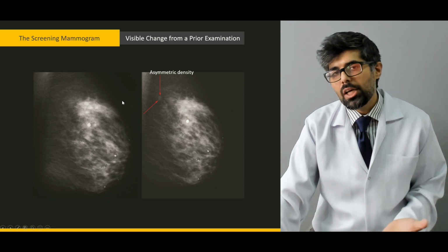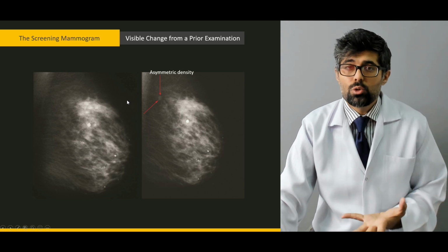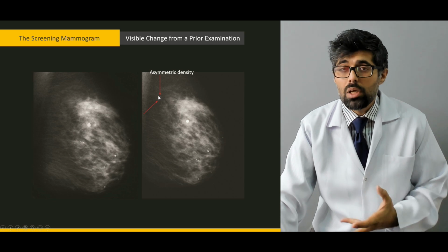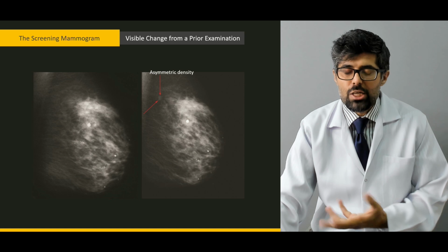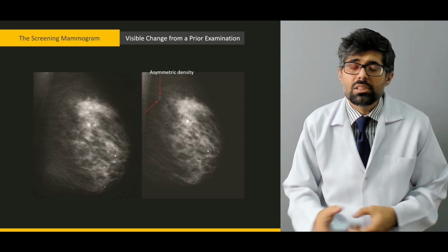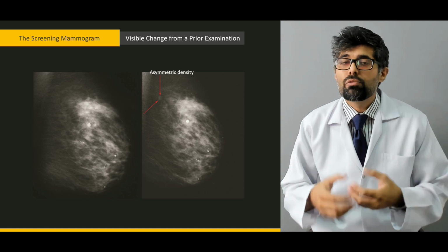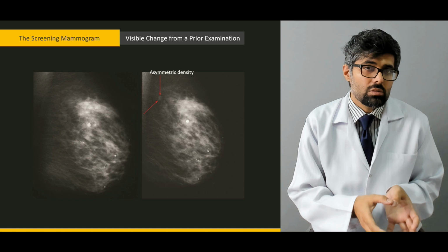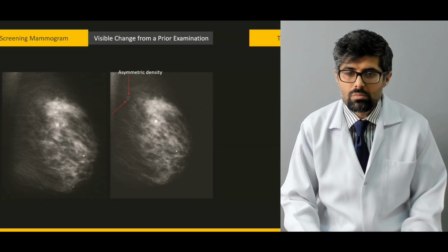So a screening mammogram is also a detection tool. So when we see this density which is being developed, we advise further investigations, further MRI, CT scan, biopsies, whatever is necessary to further diagnose what is happening and what kind of density it is.